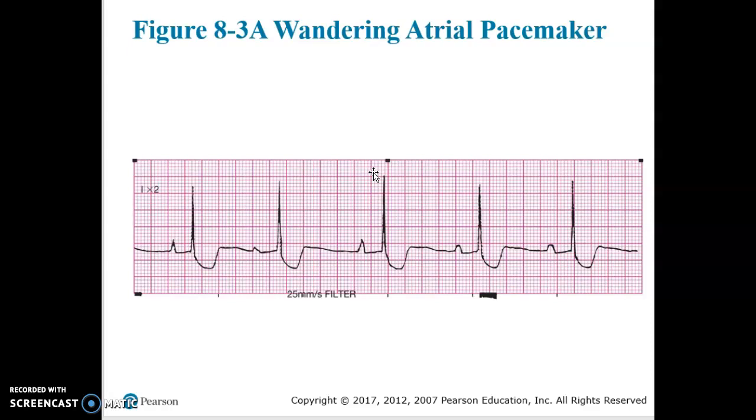So we know that we have an irregular rhythm, so we're going to have to use the 6-second strip method, where we find our mean rate and then we find our range. So we have a range of 50 to 60, and we have a mean rate here of 50. Okay? So what is our heart rate here? We figured that out.